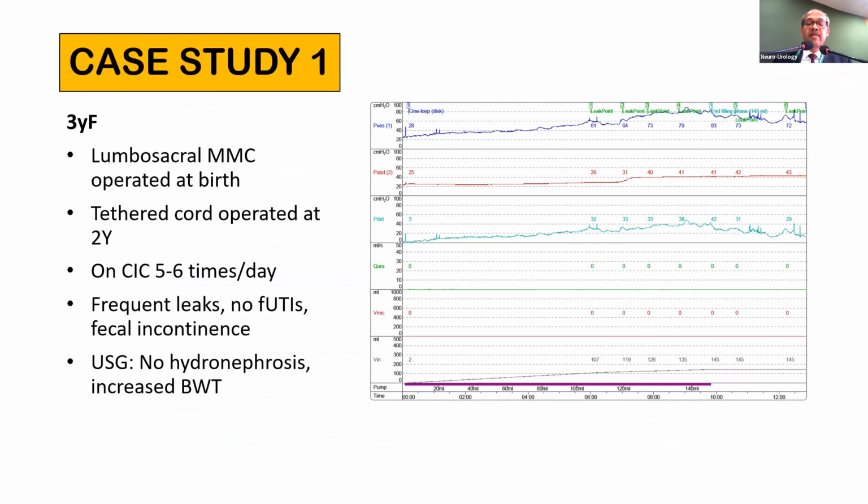That is her urodynamic tracing. You can see that as the bladder fills up, there's a progressive rise in pressure. You can also see small phasic rises and falls characteristic of neurogenic detrusor overactivity. With each of these rises and falls, and at other points through the filling phase, she has multiple leaks. With these leaks, often the pressure starts dropping as the leakage happens.